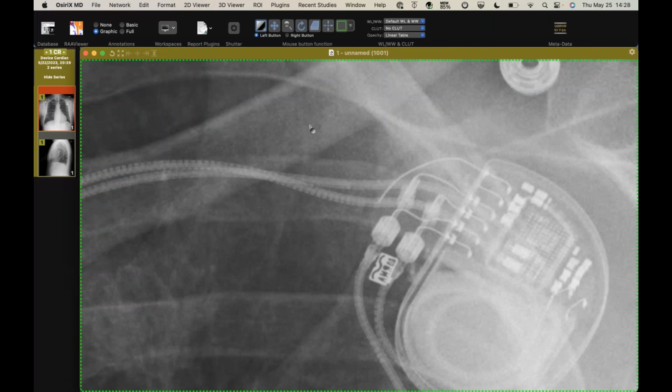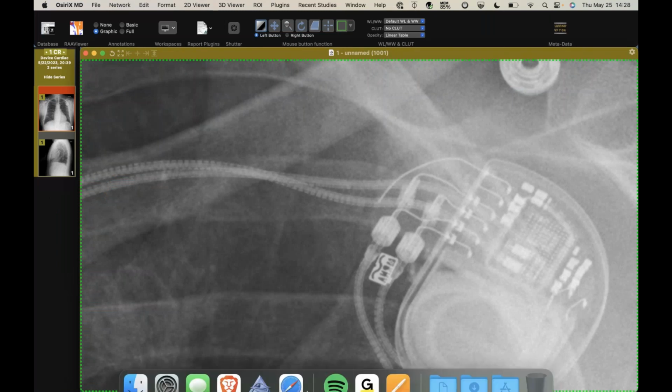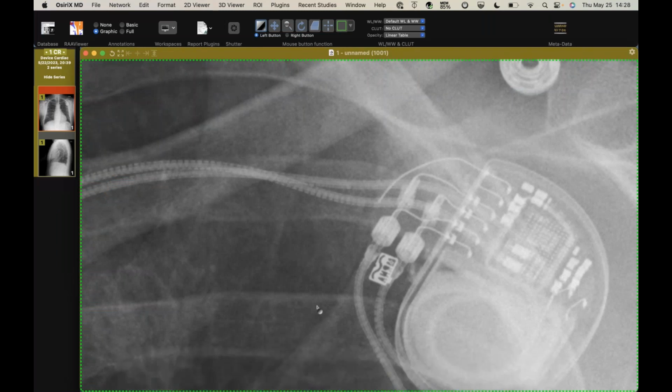So this is what I was talking about. I apologize. Someone decided to turn on their truck. You can see this pacer here. See how it has the more corrugated look to the insulation. You can see there's like little gaps in different areas. This one's not so bad, but sometimes I've seen them where they stretch out more, and sometimes I wonder if there's like a little disruption in there or not.